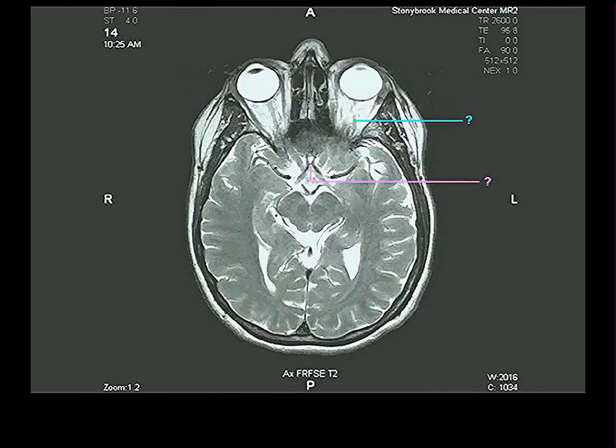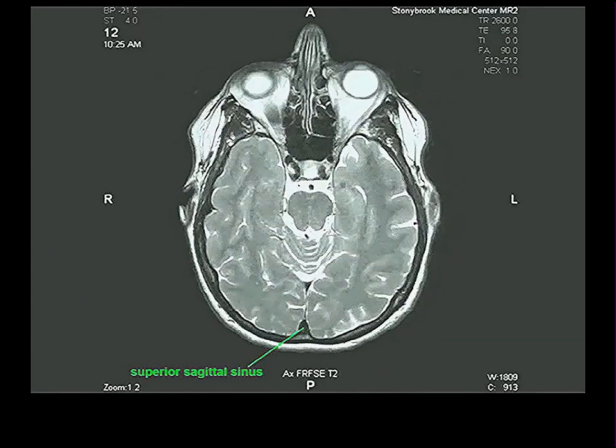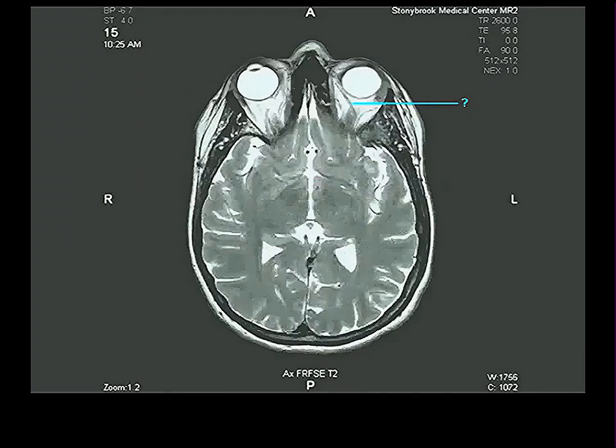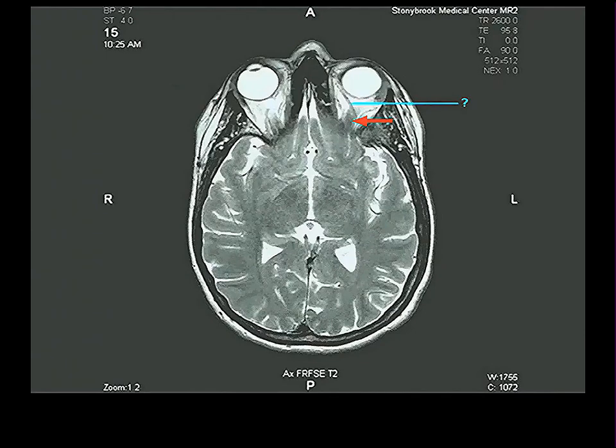Continuing up, what about this thing? Going mainly anteroposterior, and in fact, if I go down a level, here was our optic nerve. If I go down another level, you can almost start to see the optic nerve here. So in this particular case, coming up one level, this artery is crossing superior to the optic nerve. Coming up one more level, here's something that runs front to back, crossing superior to the optic nerve. Yeah, superior ophthalmic vein. And the next thing we should see here is what? Superior rectus. And here's still a bit of the vein. That's a bit of the superior rectus.